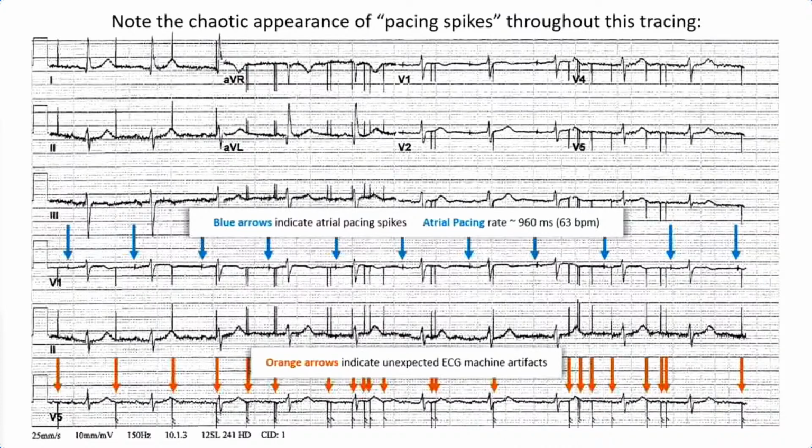But I look at it simply like, not every spike is a pacemaker spike. And there's nothing there that remotely suggests that it has anything to do with the implanted system. So it could be a clanging lead, another redundant lead, or it could be something outside. But there are no leads outside, and there are no clanging leads. No, I looked at it from a more practical standpoint. I looked at this and I said, it's just artifact. Who cares? It is artifact. I don't know why it's there. I'm going to let you tell me.